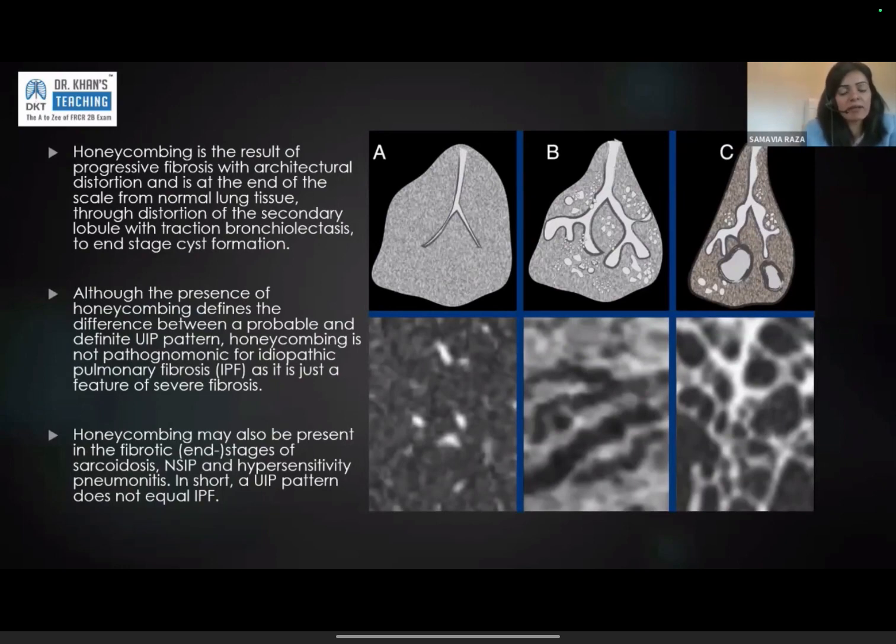So that's why we ideally recommend that when you see a cyst sitting right up to the pleural surface, can you convince yourself this is just a cyst, or are you sure this isn't a bronchus that is seen out of plane? So the lower half of the bronchus is in another slice, and you can see the top end of the bronchus sitting on the pleural surface, and it looks like a cyst, but it's just an end-on bronchus. When you see them stacking up to each other, 2, 3, then you can be sure this can't be a bronchus.